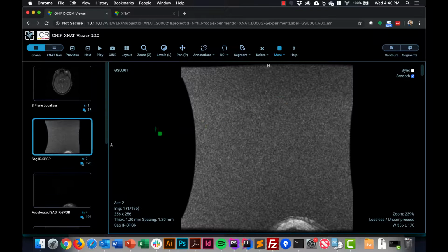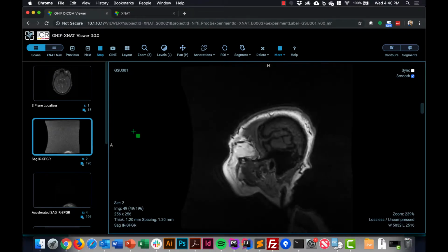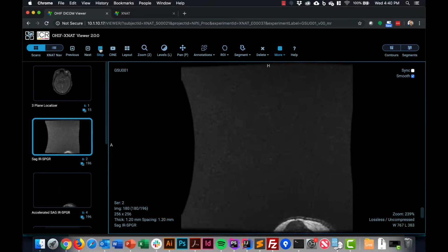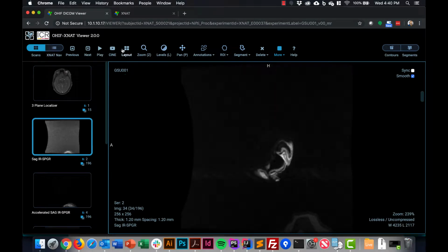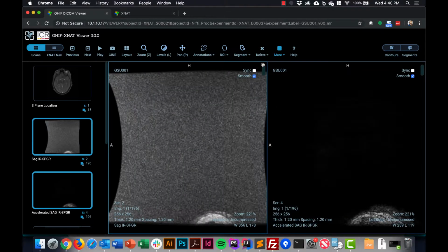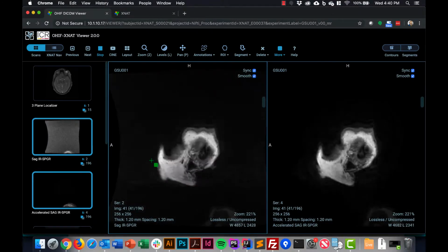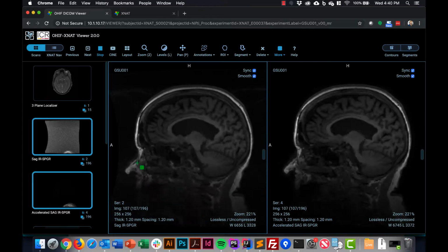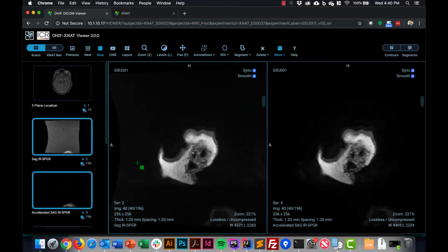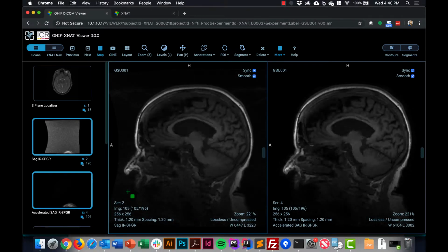So one thing that's super cool right off the bat is the ability to auto-play or auto-scroll a given session. You can control that by using this play and stop button that's up here on the left. And this actually works for synced scans as well. This works well if you have two scans that are captured on similar parameters. In this case, we have two from the same session. This would also be useful in comparing longitudinal sessions. And our next couple of demos are actually going to focus on a longitudinal scenario.